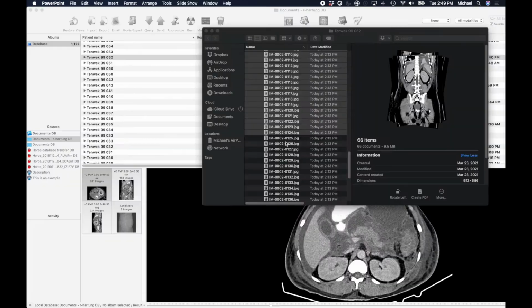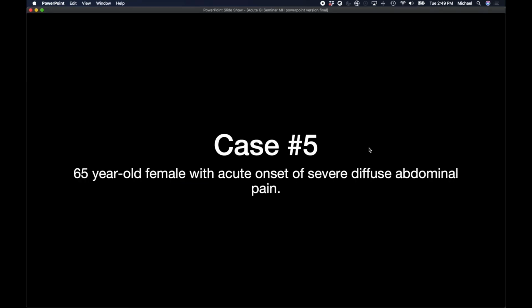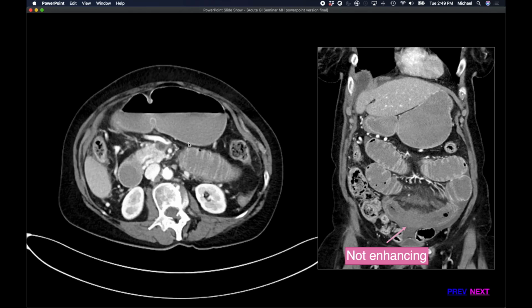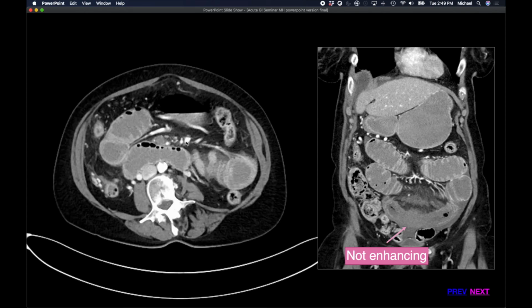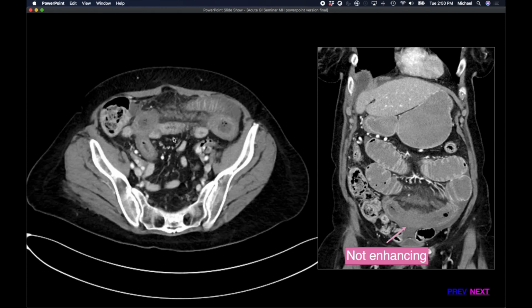A couple of additional tips that I'd like to share with you, and these are from a course that I made for the medical students. So this is the case STEM. And what I found is helpful for learners, especially beginning learners, to have next to a series is a reference image of the coronal or an orthogonal plane that has maybe some annotations to help to guide them. So here I'm scrolling through the axial images, but I show them a coronal image as reference.